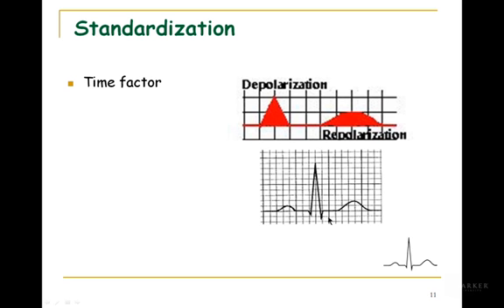So you have the Purkinje system that's involved in depolarization, so it's very, very quick. The repolarization of the ventricles does not involve the conduction system, so it's fairly slow. So that recorded voltage is kind of being extended out in the period of time. So overall, what you see is the amplitude is much smaller. But if someone sat there and tried to measure the area underneath these curves, they're going to be the same.